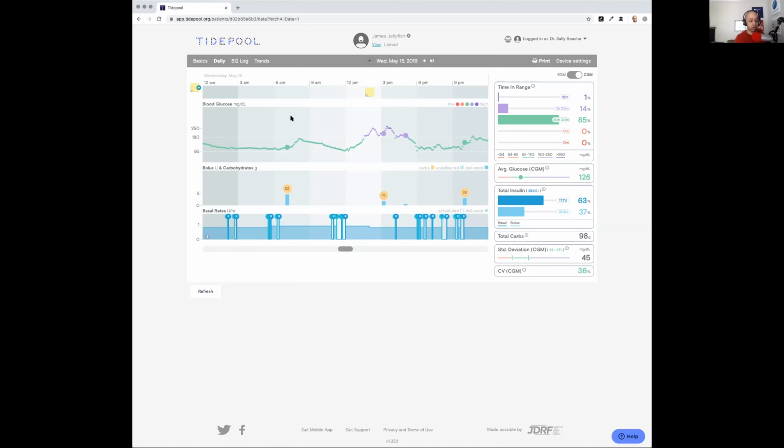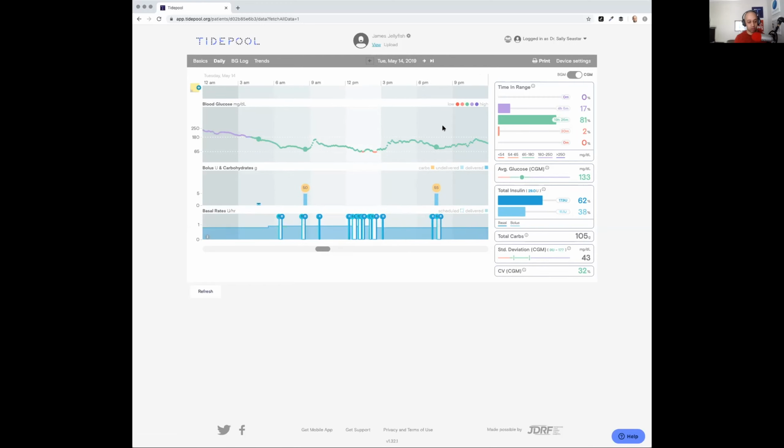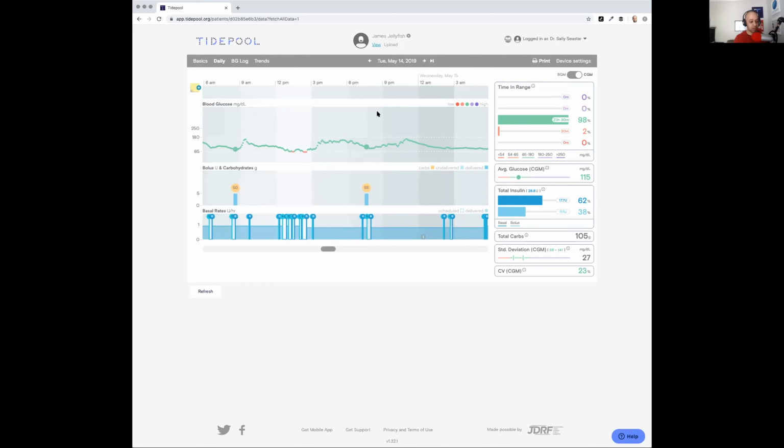As you scroll around, you can either use these arrows at the top, or you can actually manually adjust and change the 24-hour time period you're looking at. Your stats on the right will adjust and be reflected on the data you're displaying. So you can kind of cheat the system here and get to almost 24 hours in range, for example, based off of that. But if for whatever reason you wanted to look at 6 p.m. to 6 p.m., or 6 a.m. to 6 a.m., excuse me, like you're seeing right here, there's an opportunity to do that based off of how you are displaying that.